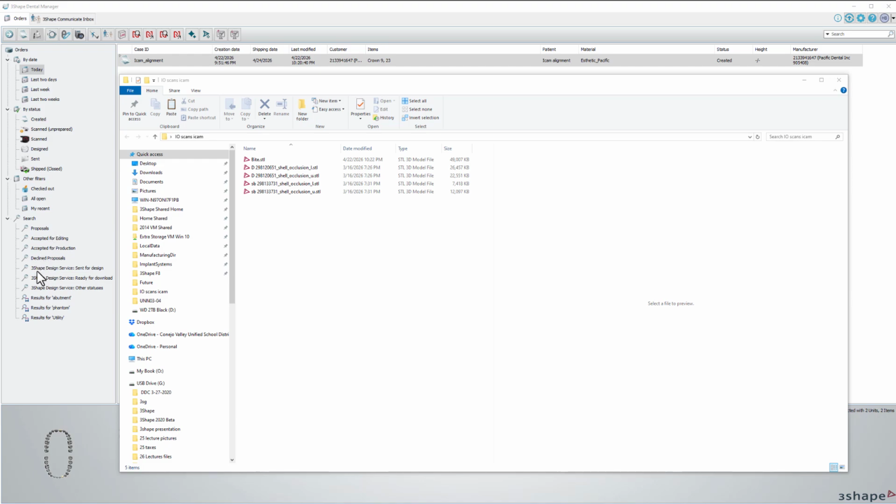What's up, everyone? All right, so I wanted to make a video about how to bring in Icam data into 3shape, or how to basically design an Icam case in 3shape. It's not really a spoken thing. It's kind of, people say, oh, it's secretive or something. It works better in Exocad, blah, blah, blah.